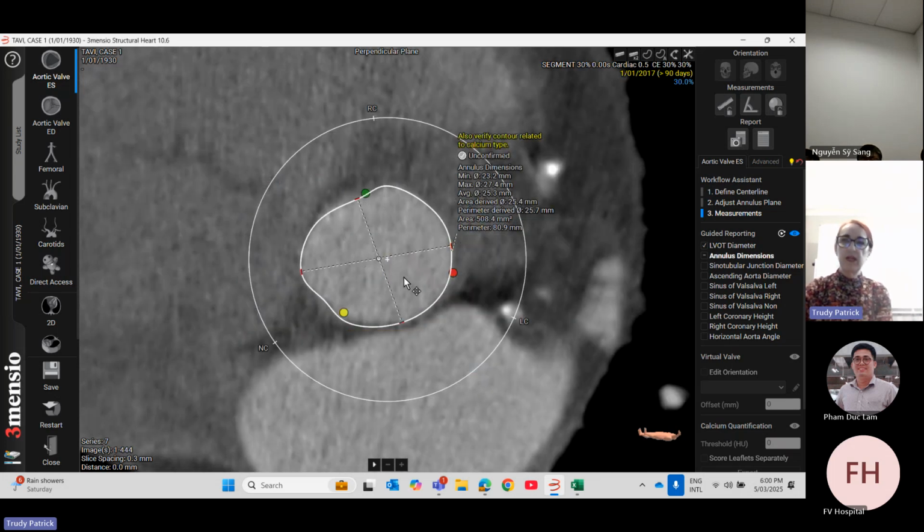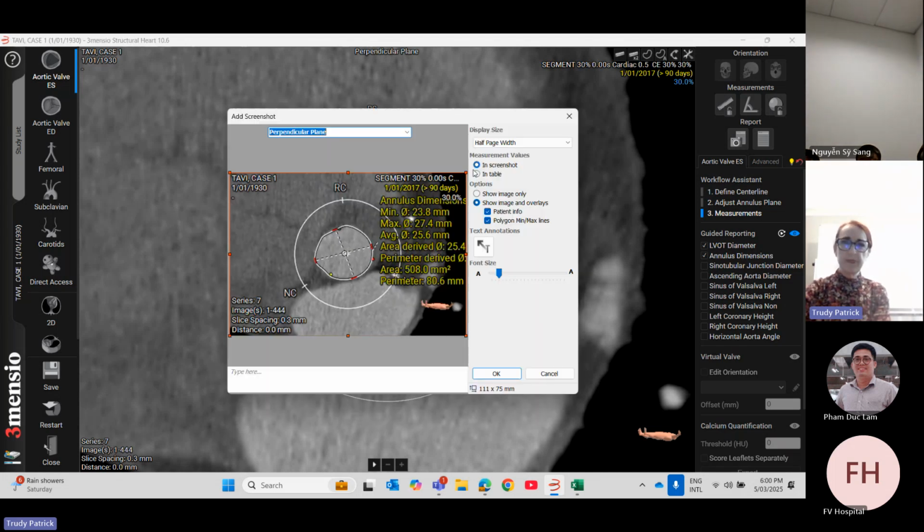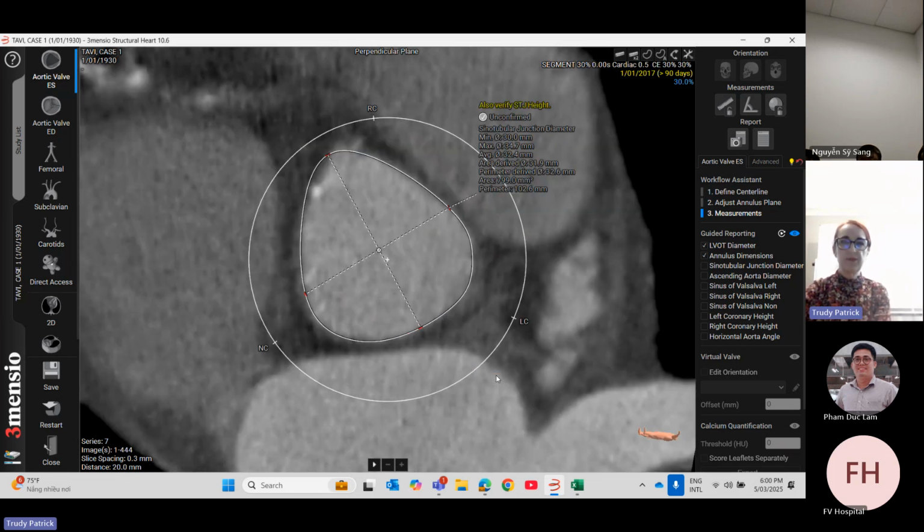What this is doing is now working its way through our list here. So we've got our annulus dimensions here, and we can just tidy up around the edges as well, and make sure that it's a little bit circular. Push this out a little bit, just to make sure that we're really happy with the perimeter. Again, it's given all our dimensions, and this will be as we confirm. And so we'll go to annulus, beautiful, and that takes it to our report.